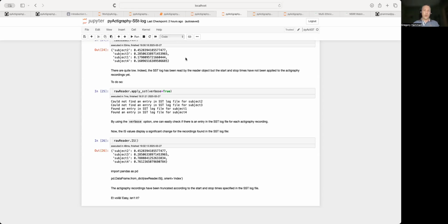This is why we created a file. It's much easier than just hard coding or chopping the raw data, which means that if you revise your criteria to chop or define what the spurious inactivity period is, then you won't be easily able to change that. Okay, so that's the end of the cleaning of the data.